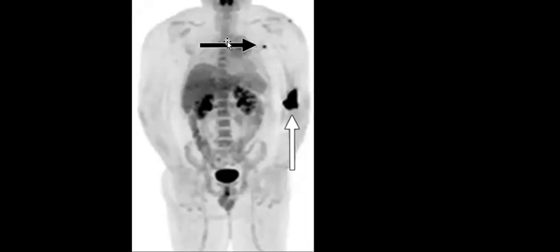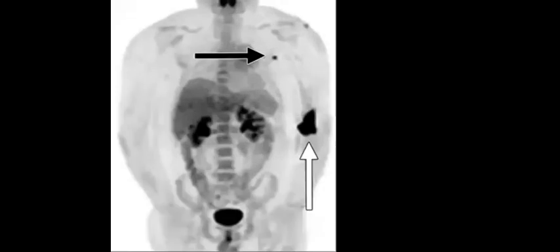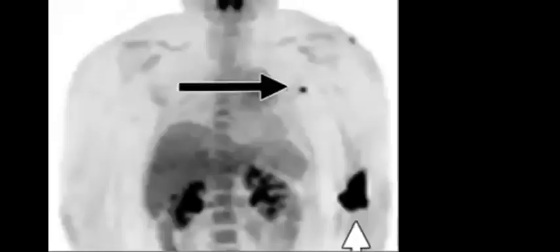I also want to tell you that sometimes the marrow appears hyperplastic or more active, and sometimes you can see the muscles and the skin a bit hyperactive. So this means that maybe this patient did some effort. Anyway, this is an injection site artifact, and this could be axillary metastasis. In this case, it is important to carefully check the axial image to see what it could be.